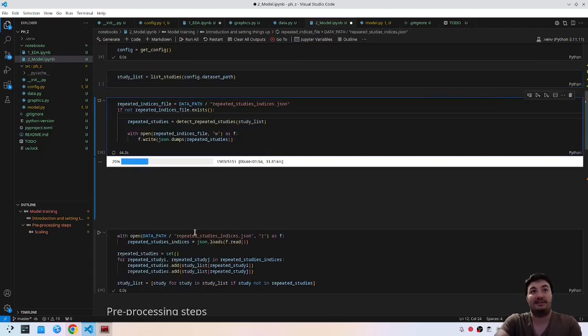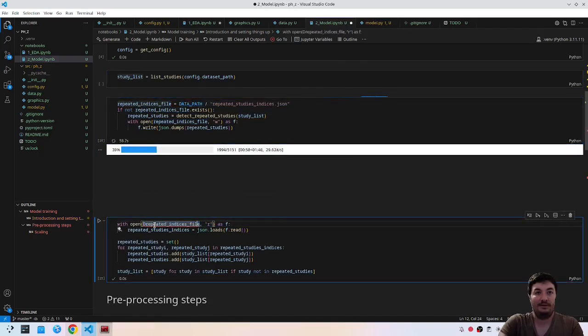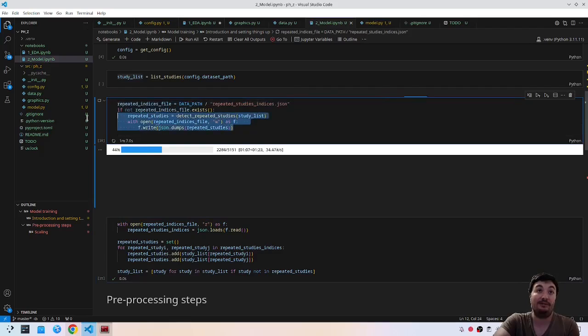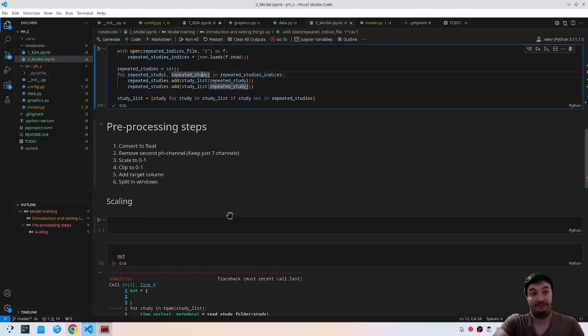If this does not exist, then we can see later if we want to keep them or not, but we try to keep going forward until a bigger wall. If we find the file, if we don't find the file, we compute everything. If we find the file, we just load it and filter.